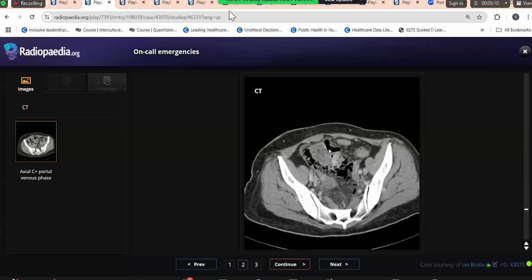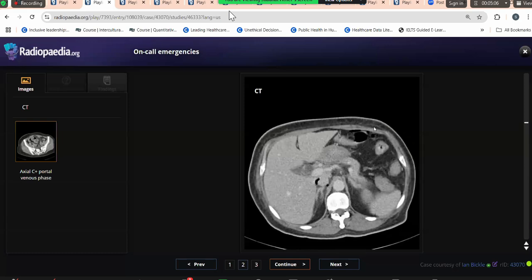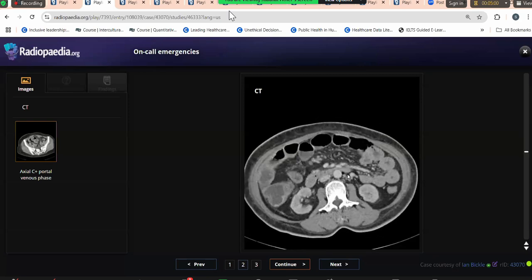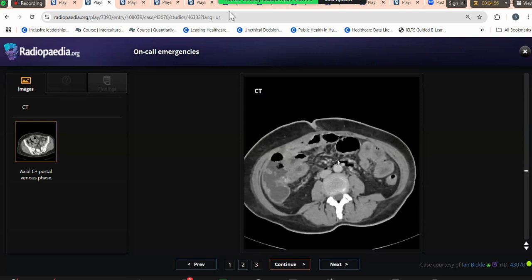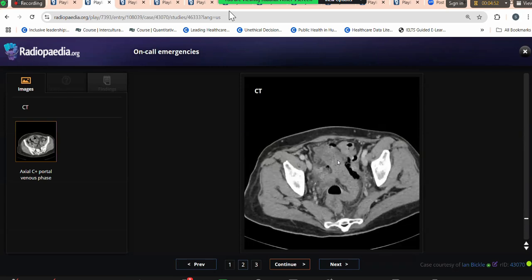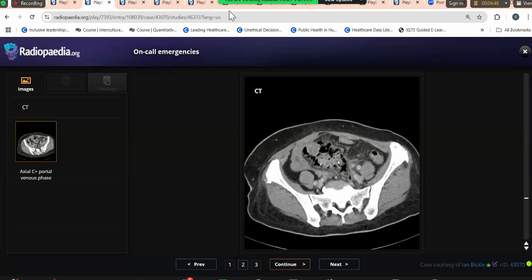There is free air, yeah? You can see even here, although this is not lung windows, that these are the air foci which should not be there. So this is pneumoperitoneum. This is an example of stercoral perforation. When the rectosigmoid is loaded with fecal matter and there's a stercoral colitis, this can also lead to stercoral perforation. So that is what this case was.